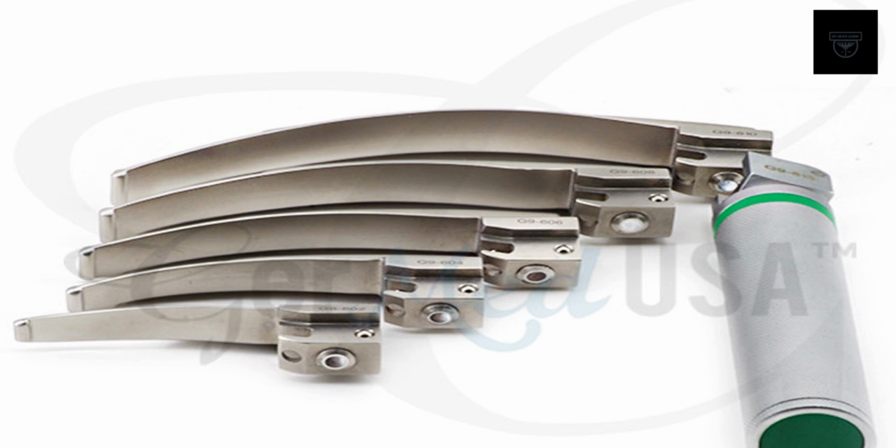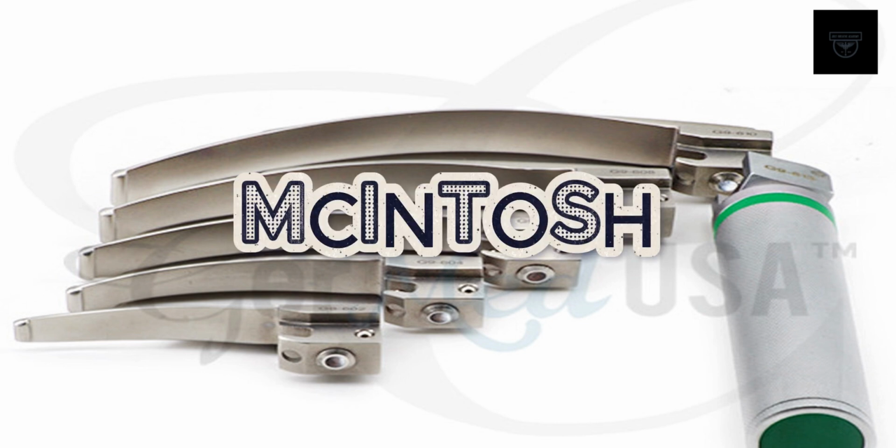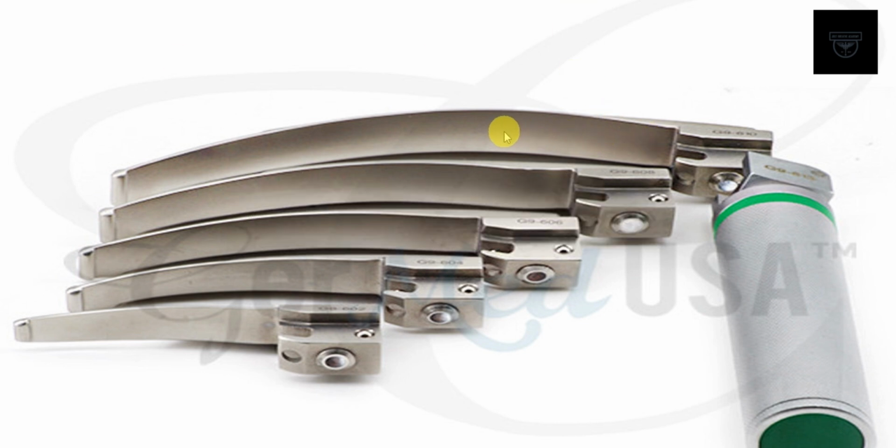This is the laryngoscope. This one has a curved tip here, as you guys can see, usually curved. You have a battery in here. Some scopes open at the top here. So you screw the top and you put the batteries in. Make sure the contact is there so you can get the light here. And it goes through the scope at the tip here. This goes into the patient's mouth.